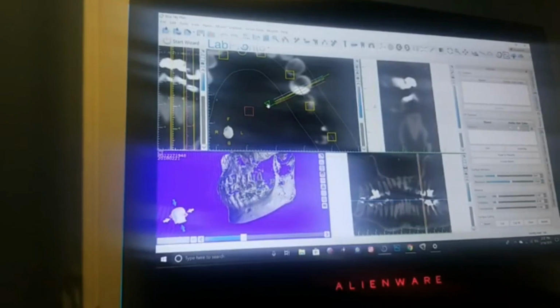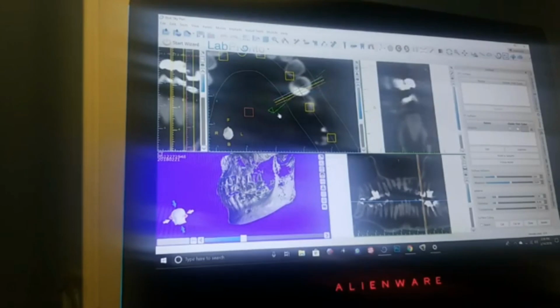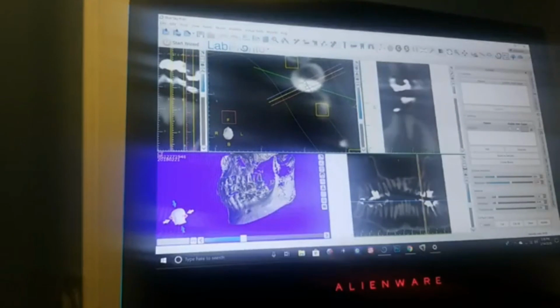Don't look at what I'm doing in the axial; take a look at the tangential view in this area. I want you to look at this image. Now I'm going to rotate this around, and as I rotate, you can see the images are changing. What is actually happening here is that this lever rotates itself around that one point.